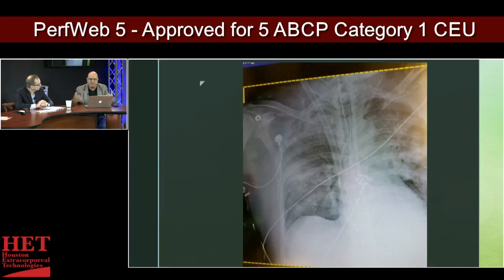Because if you first put it in, we sort of know whether or not it's working, but the first thing we're going to do is check whether the oxygenator is working. I guess we could do a venous saturation and see, but even then, the cannula is still going to have some recirculation to it. The real question is, is there a way radiographically to confirm, or do you need to do a TE? It's good to give you a general idea, but is it specific enough to confirm that it is actually where you want it to be?